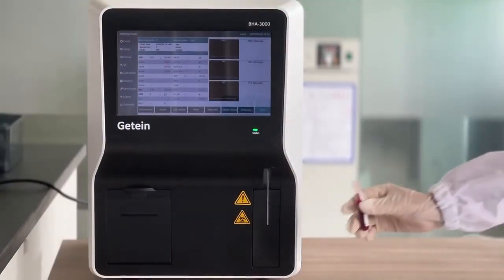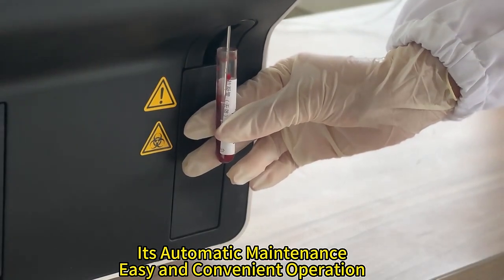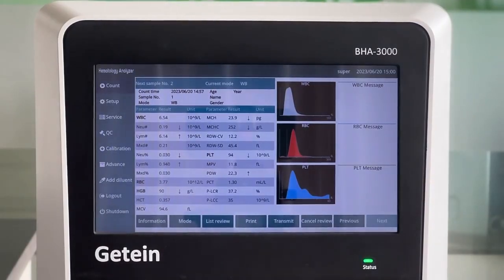Put the mixed sample under the sample probe, and press the test key to start counting. Remove the test tip after sample aspiration. At the end of countdown, the result will be shown on the screen.